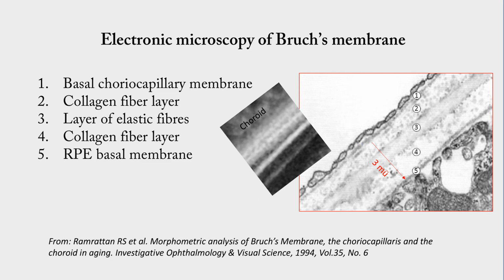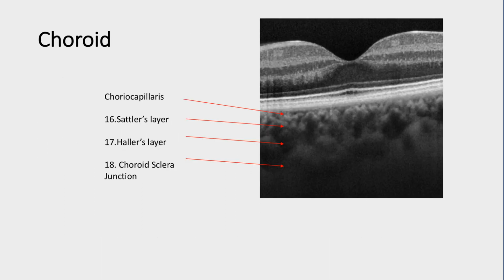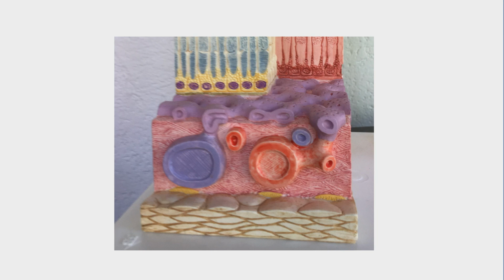Carl Ludwig Wilhelm Bruch, 1819 till 1884. This new OCT allows you to take a more than detailed look at the choroid's structures. This is a 3D model.